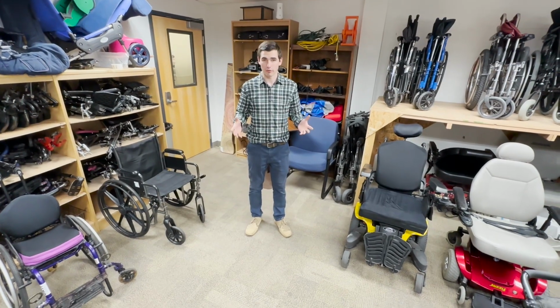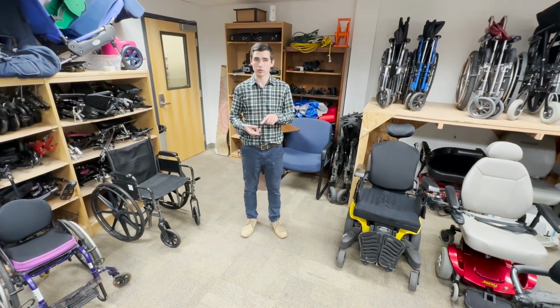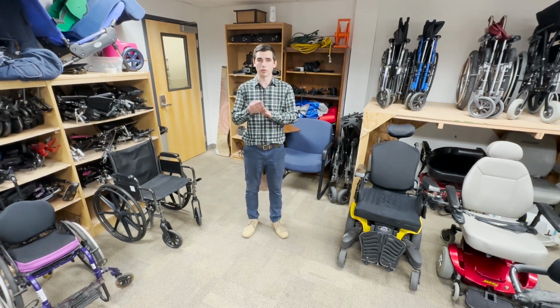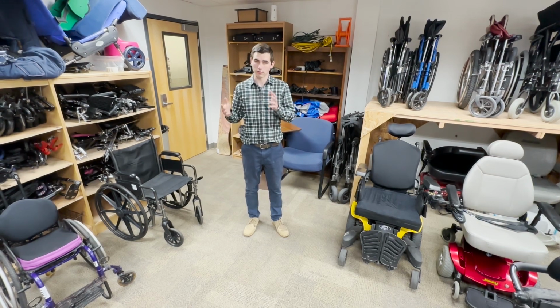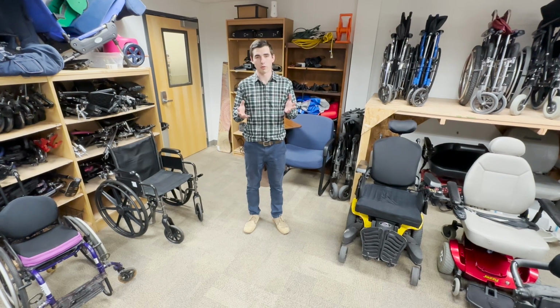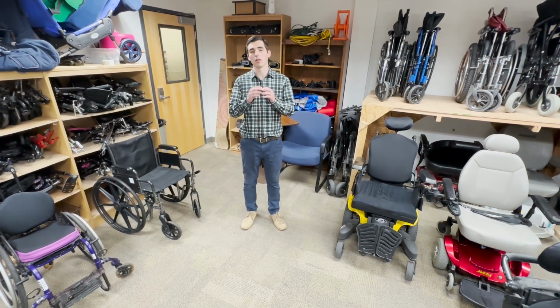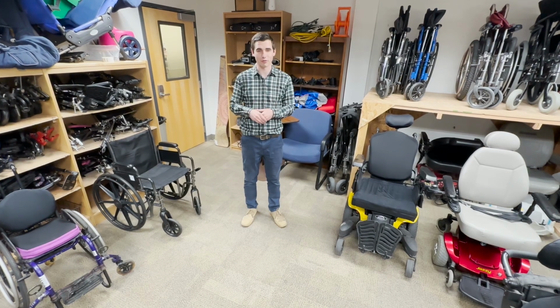As a recap for some of this, I want to help you remember that the things we talked about with pressure sores, seat measurements, angles, conforming the chair to the person, all of that matters for someone who is in their chair for a majority of the day. It's not for grandma who's getting in it for a short little trip, or coming out of the hospital, or people who are in it but can still shift and change. Maybe they just need to take the weight off their knee or their foot for a while. It doesn't matter for them. You're not getting enough pressure sore changes for any of this to be relevant.